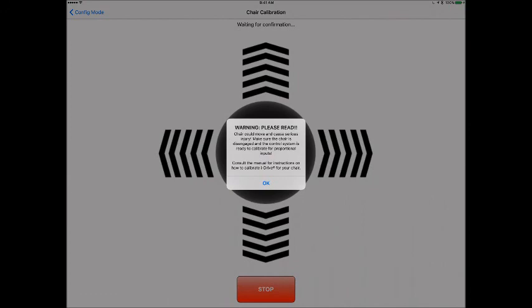We are programming our interface as a proportional function, and there's a reason for it. We have a lot of proportional devices that we're coming out with. Of course, we have our joysticks that plug in that are proportional, but we have a sip and puff that's coming out that's proportional, and we have other devices that are coming out in the future that are going to be proportional. And so it was just easier for us to keep one input type of function, and proportional was the more accurate type of reading that we wanted.